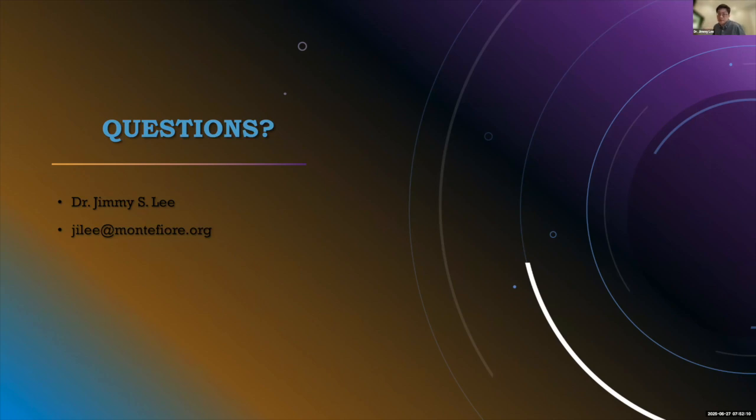Usually that's fine. But remember, you can also get dural thickening without contrast. You can see it on FLAIR. It might be tricky if it's very thin. So ideally a post-contrast to look for that pachymeningeal enhancement. And depending on the technique, you can also see the venous engorgement better. So if I would say anything in a routine brain, you want to have a contrast. That will probably cover most of it.